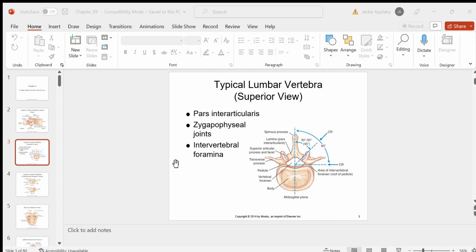And you can see that they lie roughly the same position on the vertebra, okay? You can also hopefully infer that if this patient rotates, because these articular facets are in the back, if the patient rotates one direction, these facets, all four, move opposite of their rotation. If they roll towards their left side, then all these facets are going to be shifted to the right, and you can see them shifted left and right on the image that you're looking at, and that'll tell you on the image if the patient has been rotated.